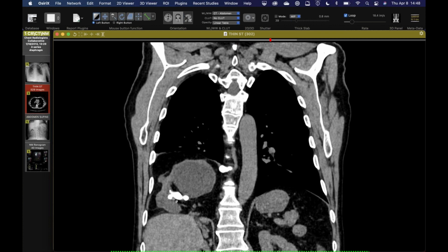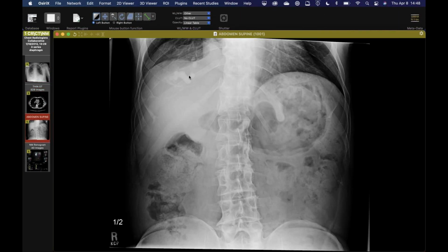Sure. Yeah, because this stone isn't as big as all of this area there. So yeah, it was just kind of a fun case. Another fun one for a medical student or a first-year resident, recognizing these unusual calcifications, because you may think this is contrast or something in the liver, but in reality, it's all kidney. Okay, well, that's all I have this week, so I'll turn it over to Steph.